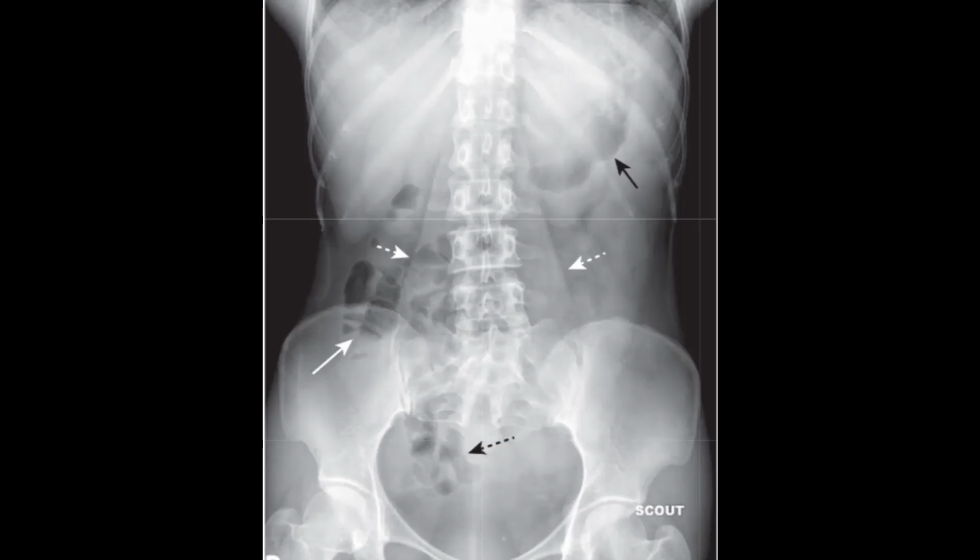Our next lesson is dedicated to the abdomen. We'll look at the abdominal wall and contents of the abdominal cavity, the viscera, the spaces that we have inside, and at the different imaging modalities, starting from the easiest one, from the X-ray.